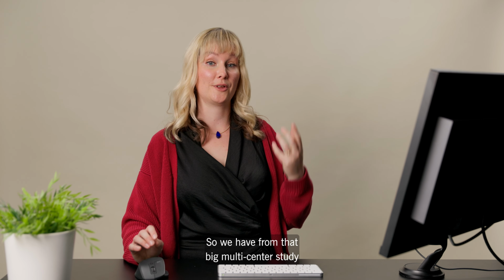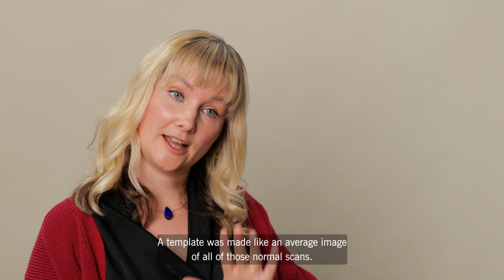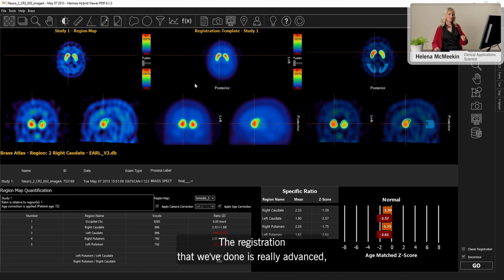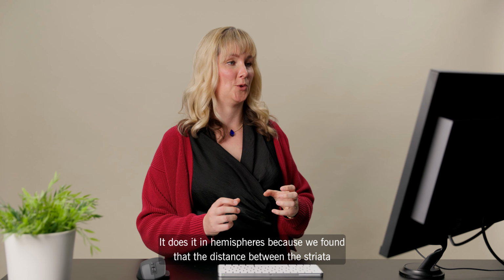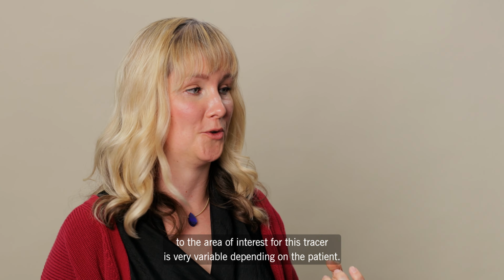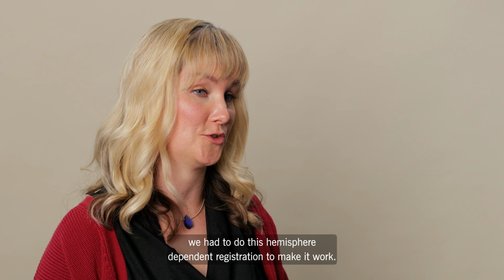So we have, from that big multi-centre study with more than 100 normal patient scans, a template that was made, like an average image of all of those normal scans, and that's what we're going to compare your patient scan to. The registration that we've done is really advanced, so it doesn't do the whole brain in one go, it does it in hemispheres, because we found that the distance between the striata, which is the area of interest for this tracer, is very variable depending on the patient. So we found that we had to do this hemisphere-dependent registration to make it work.